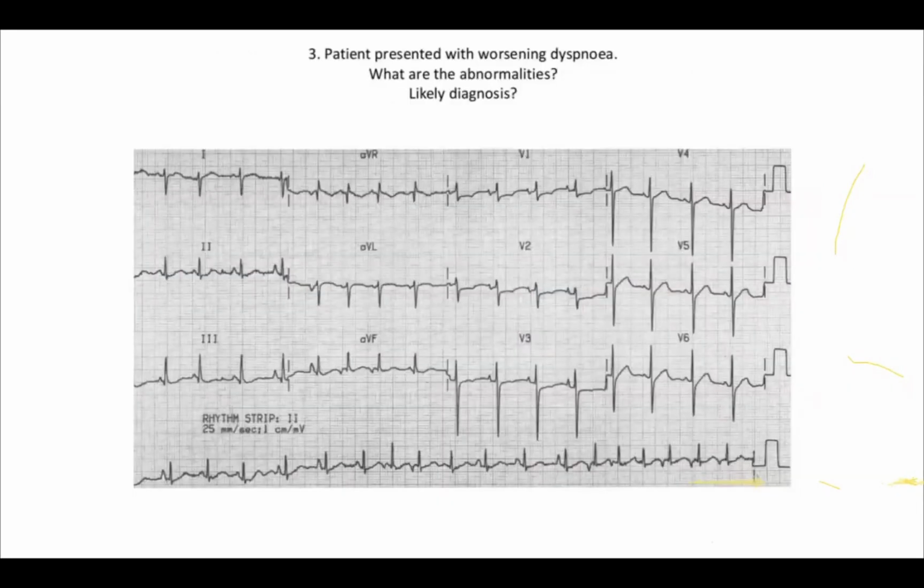So in this ECG, what are the things you see? What are the abnormalities you see here? Again, comment. It's S1, Q3, T3. You have S1, you have a Q in the... So very good. Your way of thinking is correct, because the patient has presented with dyspnea. Yeah, jolly well.